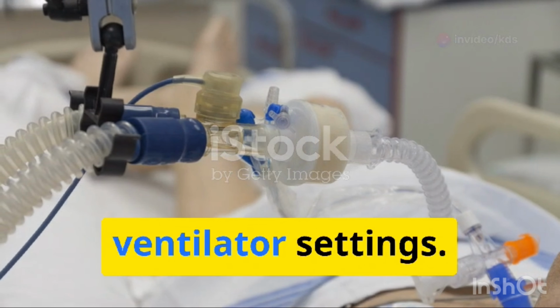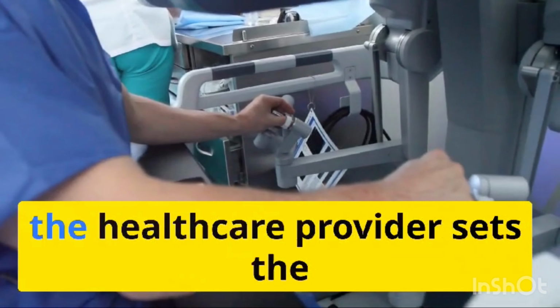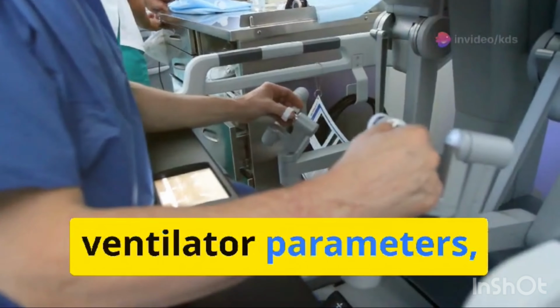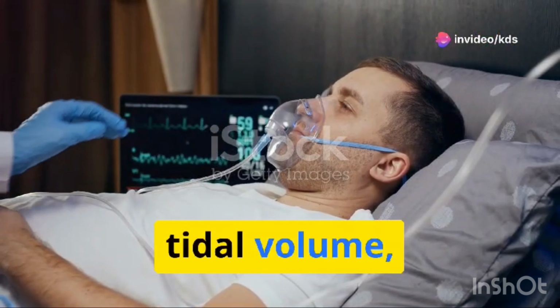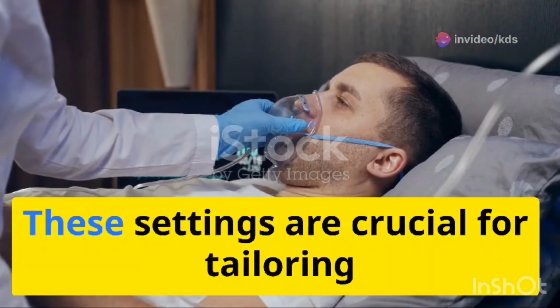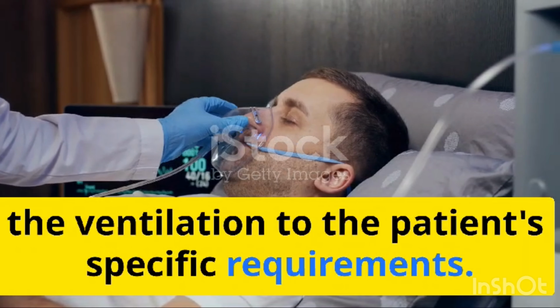Following that, ventilator settings. Based on the patient's condition and needs, the healthcare provider sets the ventilator parameters, including the breathing mode, respiratory rate, tidal volume, and oxygen concentration. These settings are crucial for tailoring the ventilation to the patient's specific requirements.